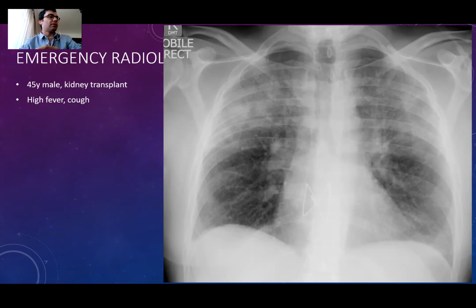Does anybody want to have a word about it? Is there B or A? I don't know, curly lines. Where? You mean curly? I'm not sure about it, but in the periphery of the lung, the lateral part. Which lung? The left lung. There are white lines invading the lung. You mean these small lines? So the right lung. Left, this area, right? This area.